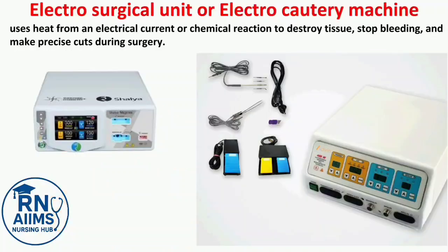Electrosurgical unit or electrocautery machine. Uses heat from an electrical current or chemical reaction to destroy tissue, stop bleeding, and make precise cuts during surgery.